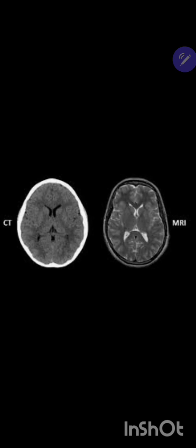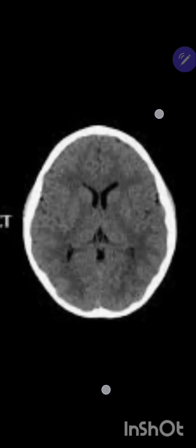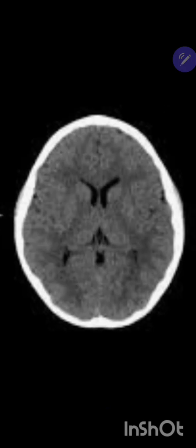So in this first diagram, this is the computed tomography radio imaging, and how can we identify that? During this type of scanning or radiography, the outer margin, which is the bony part, is very thickened and has a white contrast.